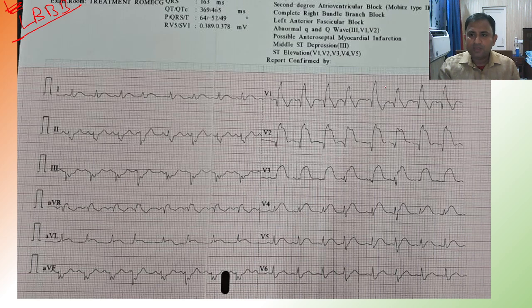So in this setup, if you see what is an LBBB, how does it look like? If you see in the lead V1, it will look like a W. But does it look like a W? It does not look like a W. Rather, it looks like an M. Okay, so M is for right bundle branch block. Mainly all the right bundle branch blocks are a normal finding in an individual. Majority of the right bundle branch block you will find in healthy individuals.